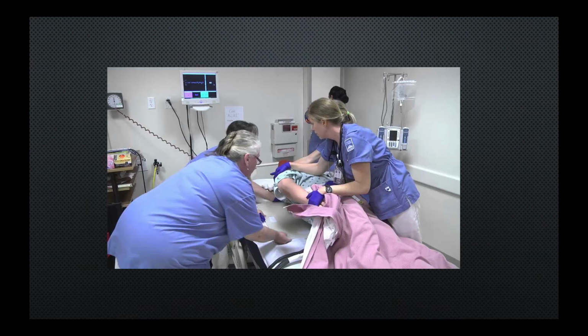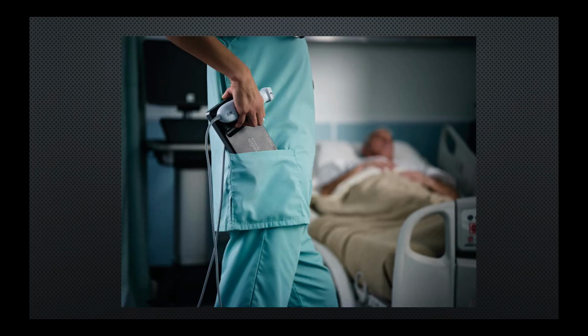It can help diagnose a cause for hypotension in a coding or peri-arrest patient doing poorly and change the course of their outcomes. And it can close the gap between the time to diagnosis and initiation of therapy, which has some benefits in preventing further clot growth and embolization. This is a skill that requires some training, likely greater than 20 minutes but probably less than 16 hours, and can rapidly be applied at the bedside to determine and course correct a potentially life-threatening condition.